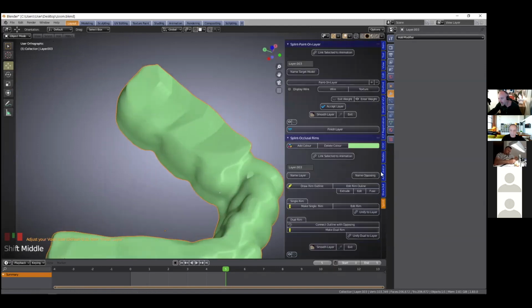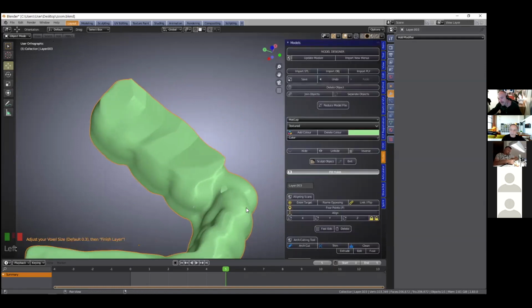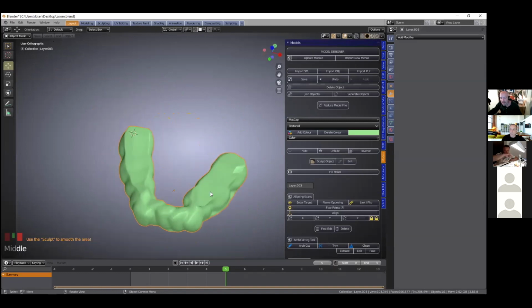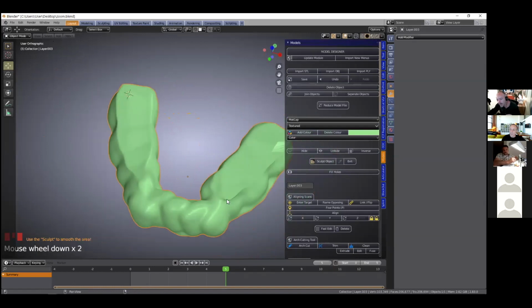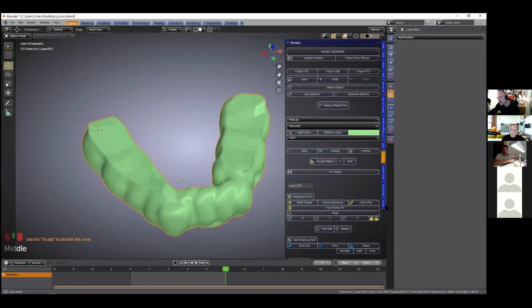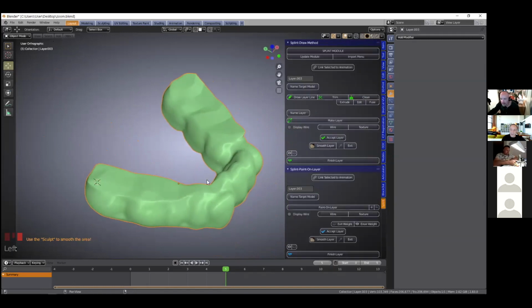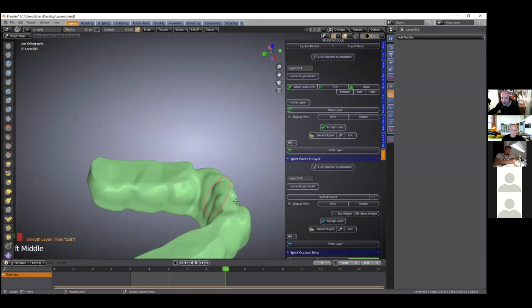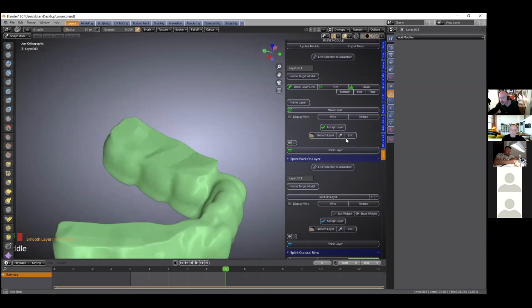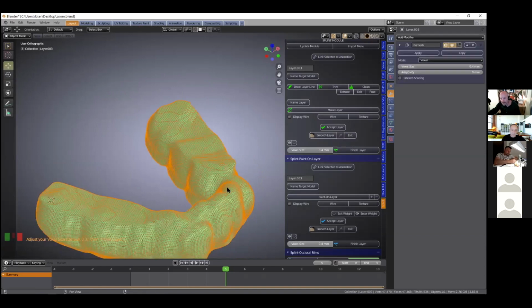I'll just block up this hole: models, fill hole. So you're just using the fill holes button. Yeah, I've just taken the modifier away, done the fill hole, and then we're good to go again. It's just a little bit of thinking outside the box. So I've filled the hole. That's all good. Exit, and this should then give me a nice mesh and finish the layer.